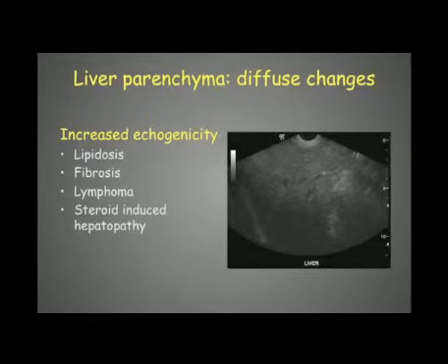In those cases of lipidosis or with lymphoma, the liver will be increased in echogenicity, but also in general increased in size, as also with steroid-induced hepatopathy. When, on the contrary, there is a chronic hepatitis, we would expect more of a decreased size of the liver.